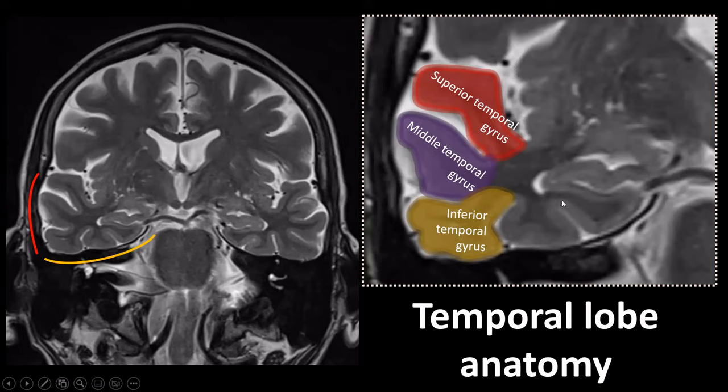And these are new. We have two basal gyri in the temporal lobe, and these run all the way to the back, so they're also part of the basal surface of the occipital lobe. And what are those? We have the lateral occipitotemporal gyrus, and we have the medial occipitotemporal gyrus, which is also called the parahippocampal gyrus. I called it medial occipitotemporal gyrus here because it makes it easy, but I would call it the parahippocampal gyrus in the temporal lobe. And situated on top of that is the hippocampus.